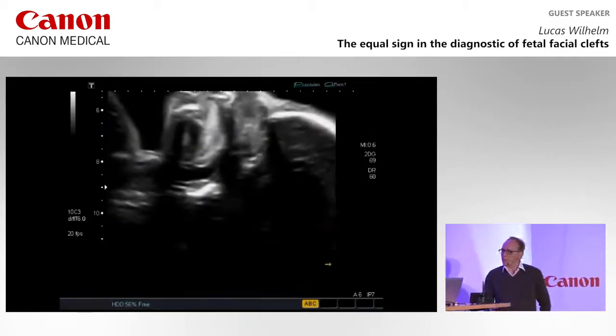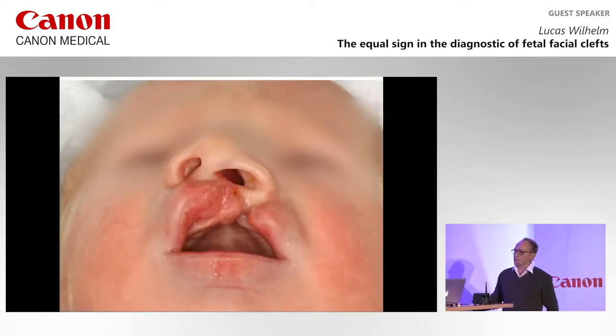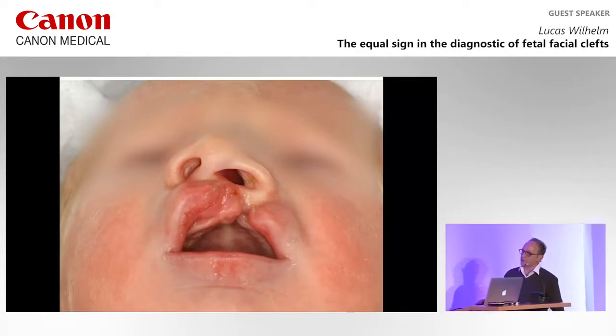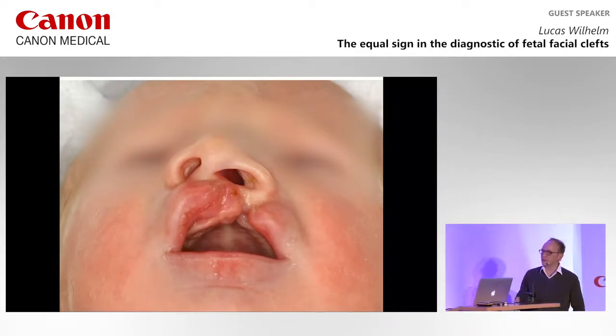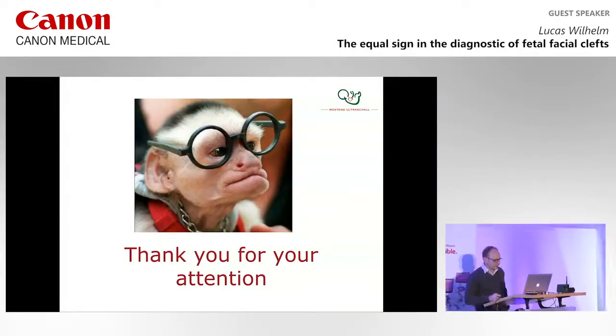So this is a postpartum picture. You see here the cleft of the alveolus and the cleft lip. So thank you for your attention. I would be very happy.